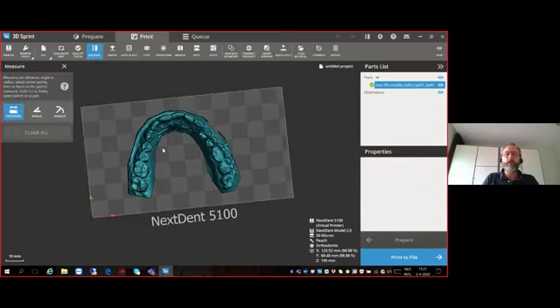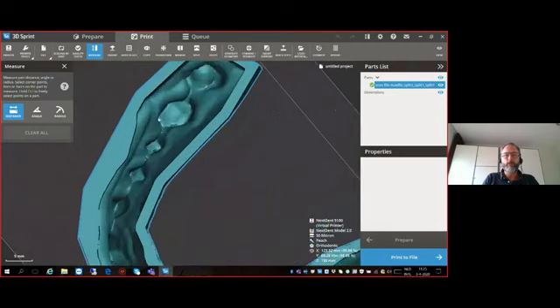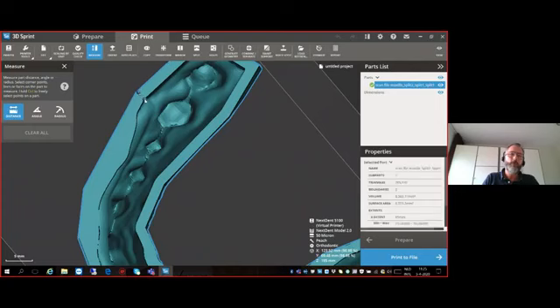A feature that might come in handy is the measurement feature. If we go to the bottom of this part, you can just go here. With control, I'm selecting a small dot now. By clicking on your left mouse button, you select the placement of the ball, the second ball is placed, and you can see I selected 2 millimeters, and you can see that this is roughly 2 millimeters. That's because of the placement of these balls.